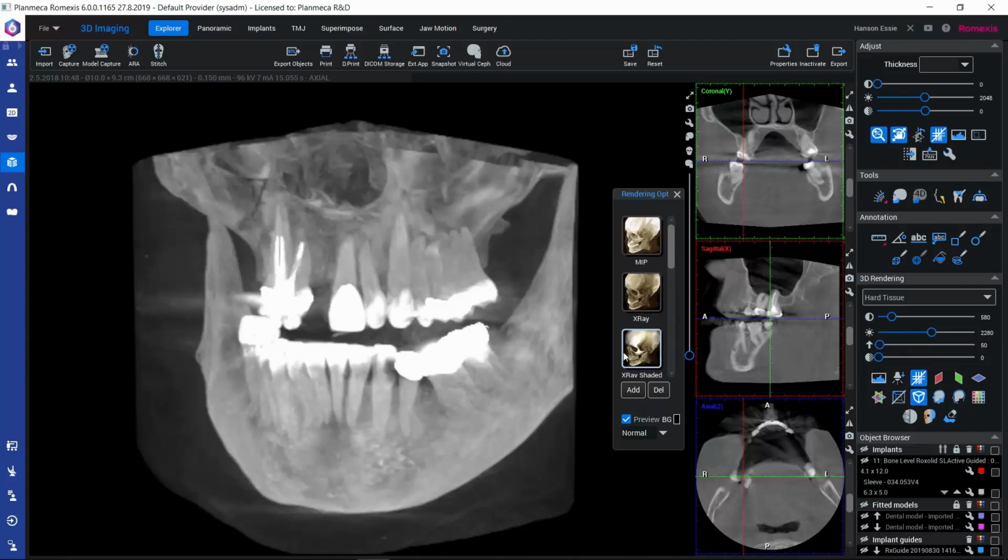And the current default preset is highlighted with this border, but if we would like to select some other preset as default, we would first select it and then right click on top of that in order to set that as default. That would be used always when opening the volumes.